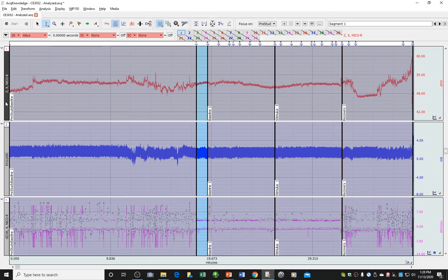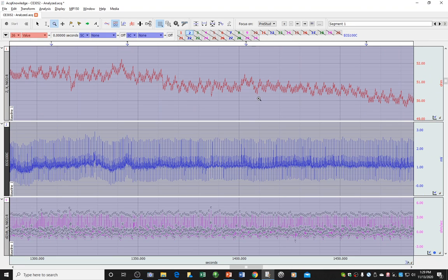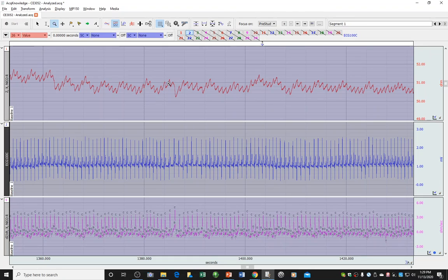The two raw pieces of data will be this Z signal. This is non-invasive cardiac output, and it is measured in a raw way. And similarly, raw data is our ECG signal. And this is for my master's research, so it's hard to visualize without zooming in. So we're going to zoom in quite a bit into an area that we think might be clean of too many artifacts.